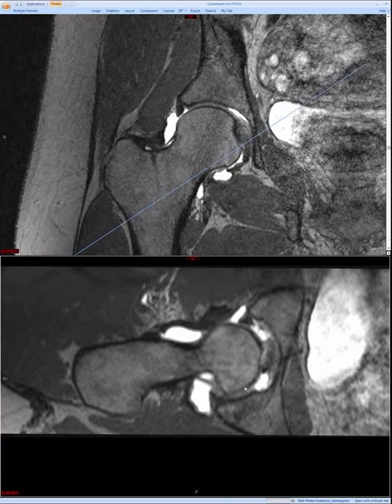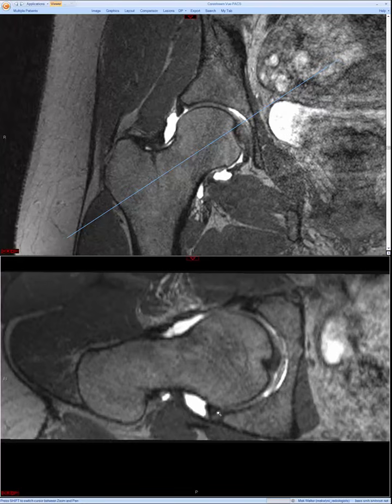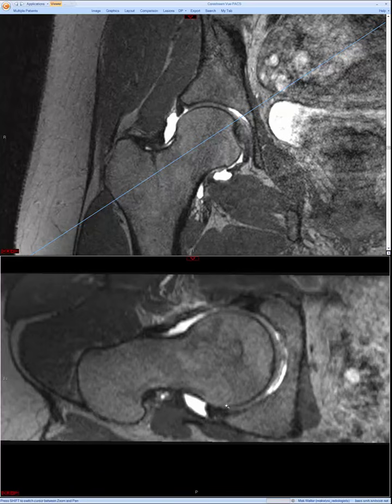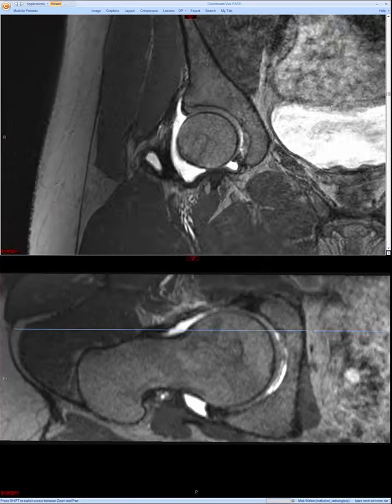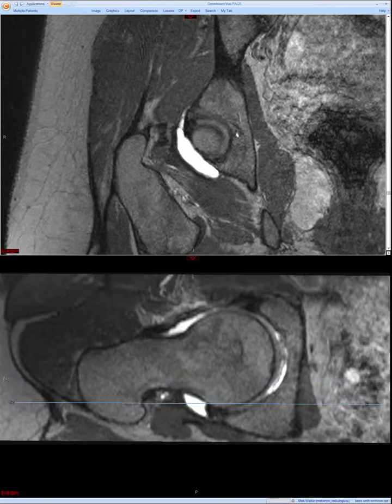That's where it's most commonly recognized, and it will be a smooth, thin cleft. It will not go through the entire base of the labrum, so this here is the base of the labrum. It would just undercut the labrum slightly and not go all the way through. But if you see something similar in one of the other quadrants, it may well be a sublabral sulcus, and then that's where you would just have to make your best determination.